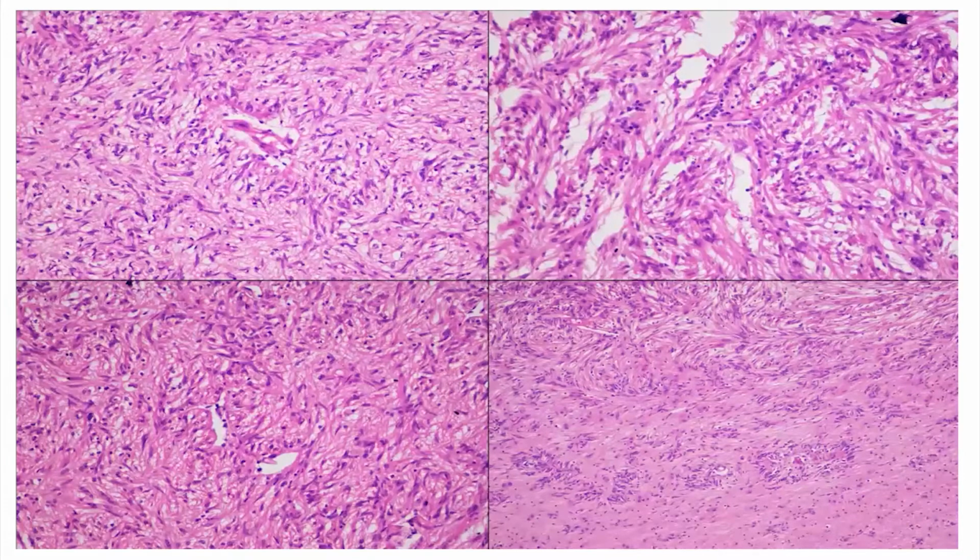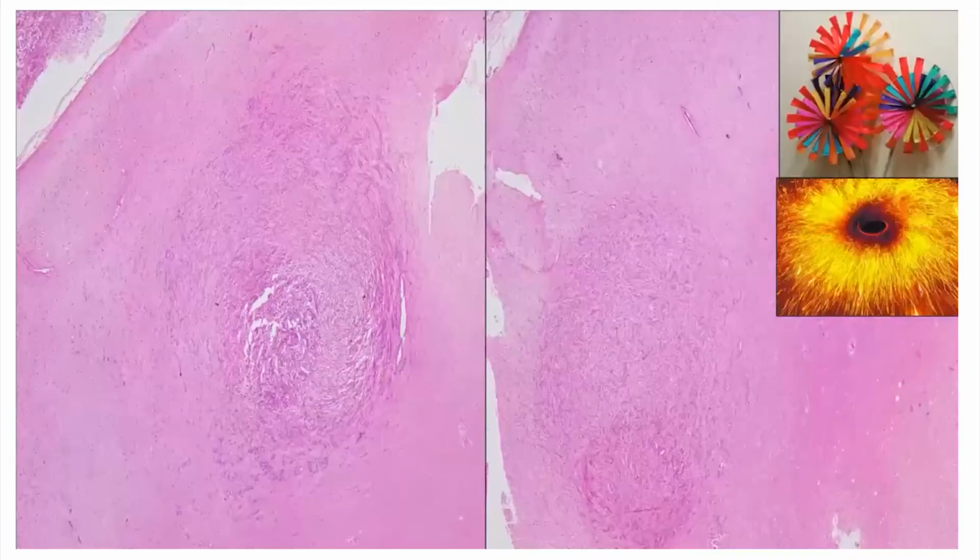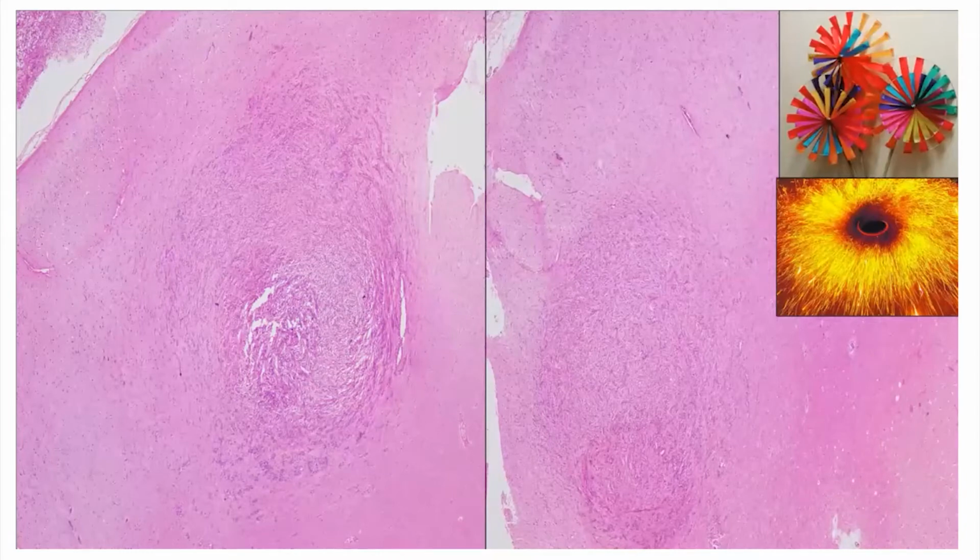But when I turned the pages of the book, then I could see that this is very much typical of angiocentric glioma. You must go through the book and see the morphology and read about it, and you will definitely nod with this, that this is angiocentric glioma. Yeah, the cortical location, the nodular pattern, and the elongated nuclei and elongated cells which are perpendicular to the central vessel. All these point towards it being an angiocentric glioma rather than an ependymoma.